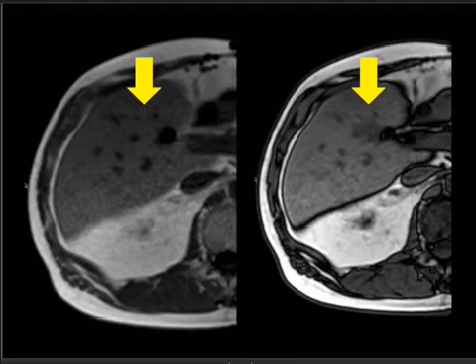Remember, they've only got so much real estate on the screen, and they may show you a bunch of different sequences to try to confuse you, but if in and out of phase is provided, you for sure have to look at that specifically with a bias that this could be a case that has to do with fat. All right, so here we can see we've got in phase and out of phase. Out of phase, the out is the outline. That's how I remember that, outline on the out of phase.